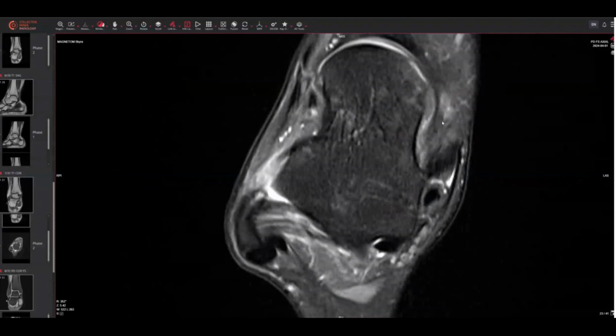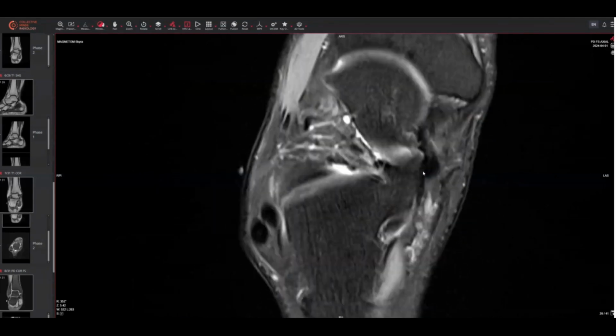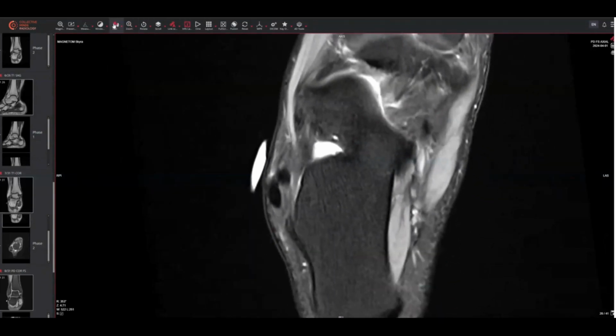The tibiospring, as we mentioned, is really the workhorse to me. It goes centrally along the medial neck. And then, of course, we have our tibiocalcaneal band here, poorly seen, but still intact. And then these medial plantar bands, we can see them partially here. Let's move this down again.